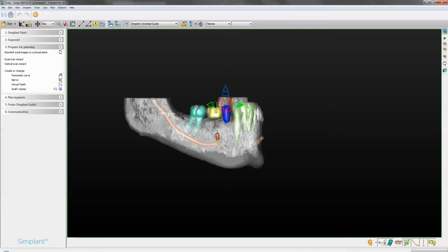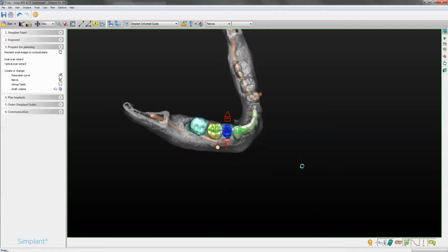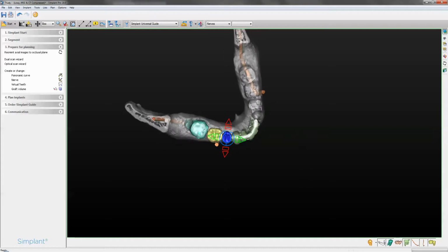The main thing that is important is that it is following, one second, I just stretched it instead of moving it to the side. So I just need to move this ever so slightly to the side. The important thing here is that you know where your lingual and buccal envelopes are of your prosthesis. So you would have to look at it from this aspect, making sure that everything is in line. It doesn't have to be absolutely perfect. It's just a guideline to make sure that you are within the right area when you come to angulate the implants.